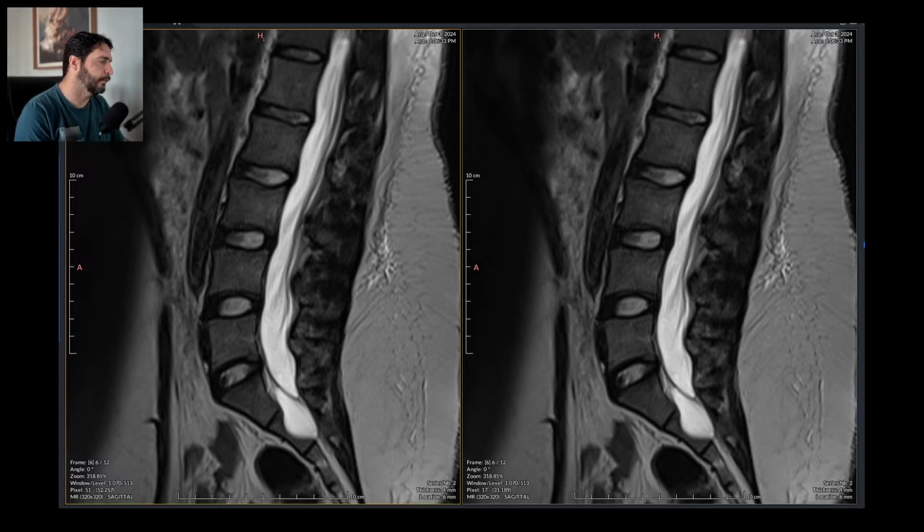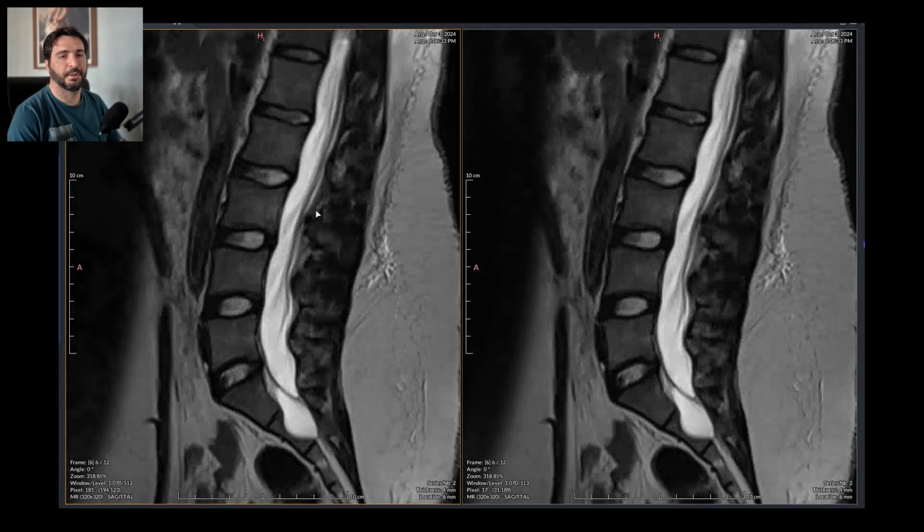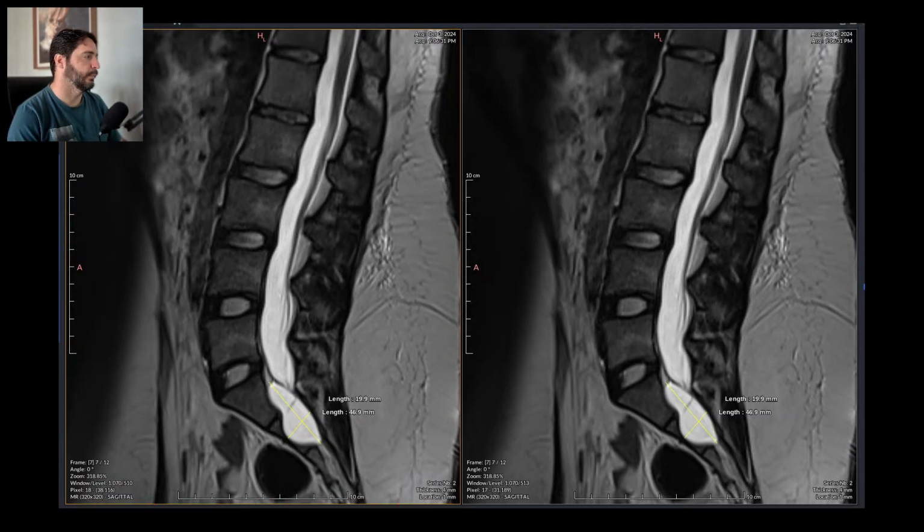And hypertrophy of perivertebral muscles. And we are done. I guess we can tell this patient has indeed been suffering of lumbar pain, just as she says. Nothing major, nothing surgical, just regular overload of the spine.